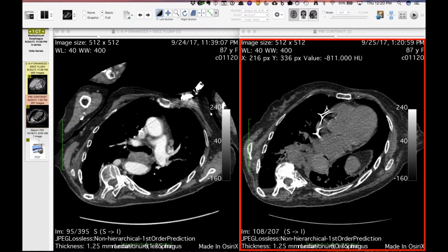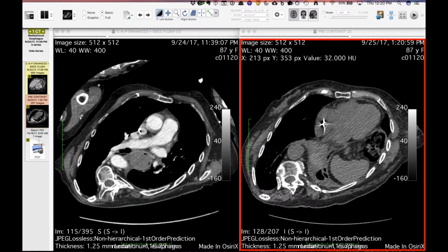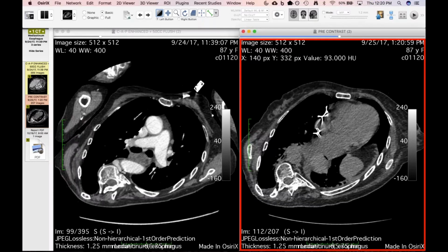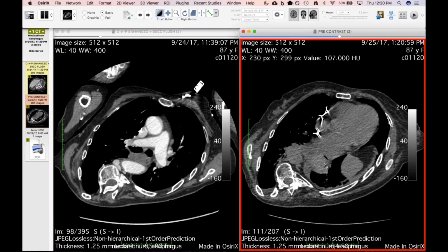Travis, I showed a case a while ago of what looked like, I think we called it an esophageal dissection, where there was gas tracking in the wall. That was kind of reminiscent of that image right there on your left, screen left, where you see that little eccentric gas collection. Yes. It doesn't quite look luminal. Right. Yeah, no, we went down the tube forgetting about that.